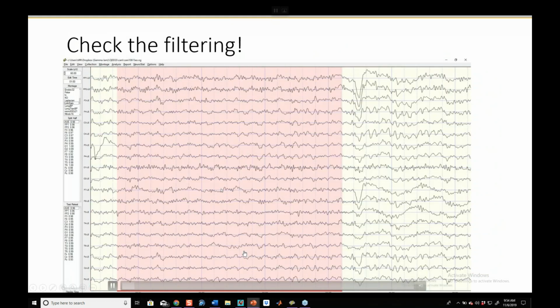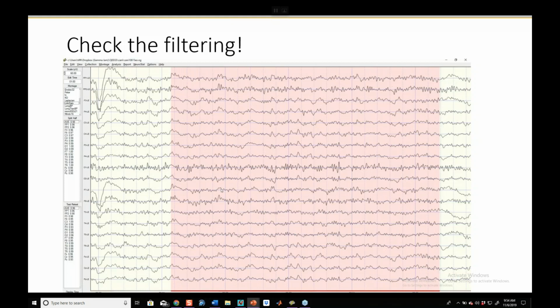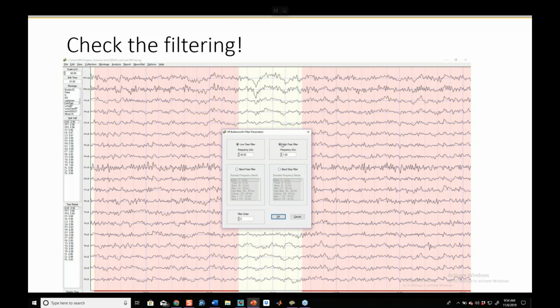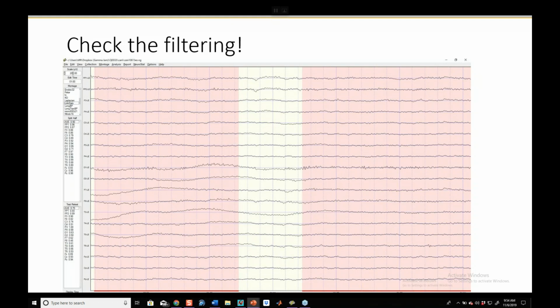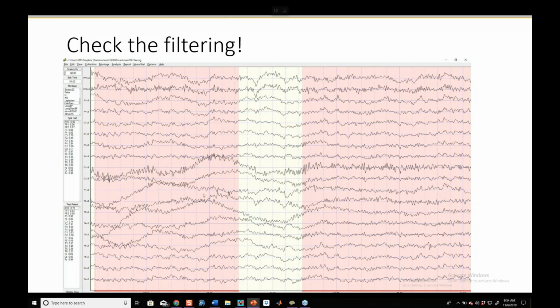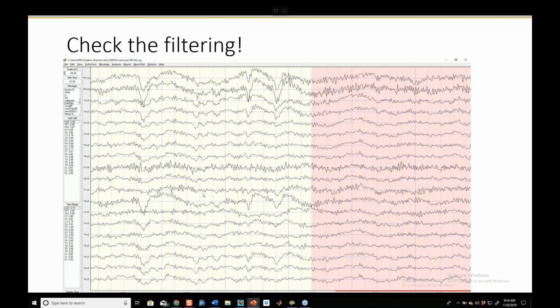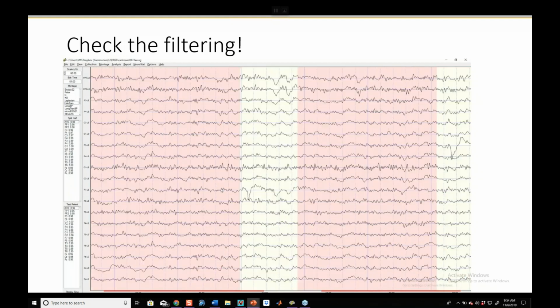This is the same person, and I'm looking at their map afterward, and I'm saying, well, there's some eye movement, but gosh, where'd all that slow stuff go? I mean, I'm not seeing any of it. So what you want to do in this case is drop the high pass filter. Now, everything under 1 hertz can come through the record. The gain automatically scales, so I'm going to shift it, and what we see is that slow waveform shows back up in the record. So your filters are your friends. They're going to be helpful.